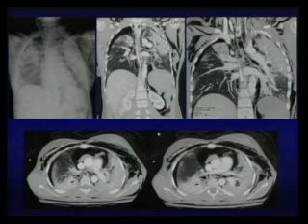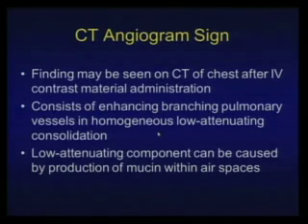Another example is this. We can see another MBC with contusion areas in both lungs. There is a pneumothorax, and here we can see the pneumothorax very clearly. You can see that there is a rupture here at the origin of the right main bronchus, giving the fallen lung sign in this particular case. So when you have that sign, think that there probably is a rupture in the distal trachea or in the origin of the right or left main bronchi.